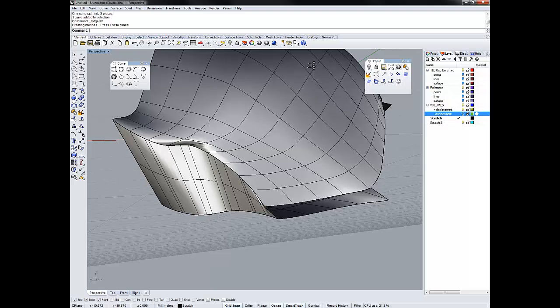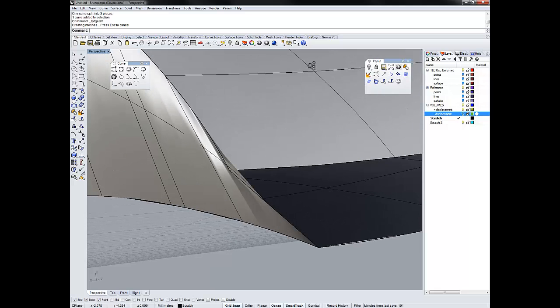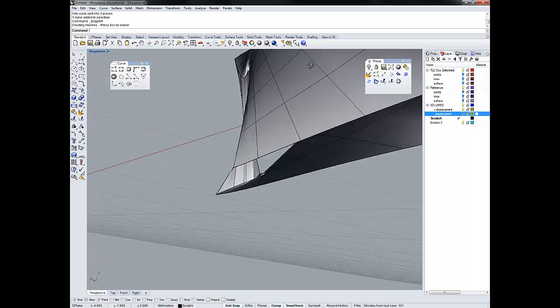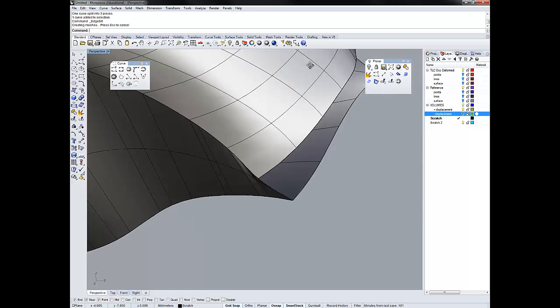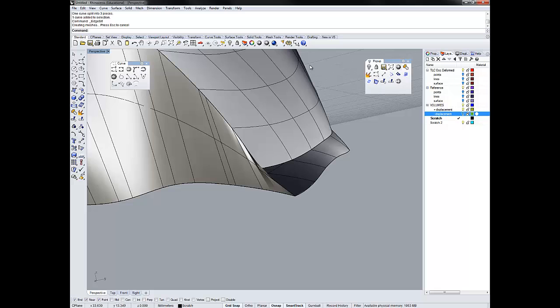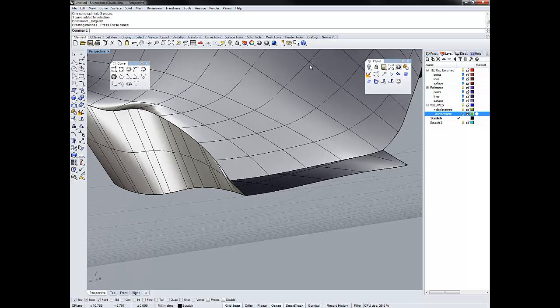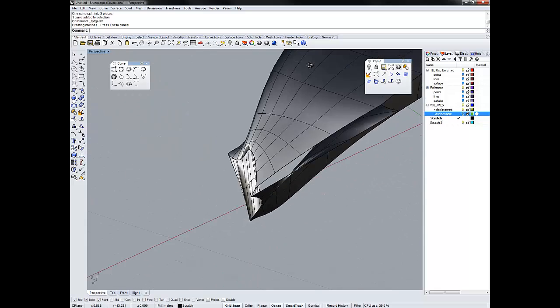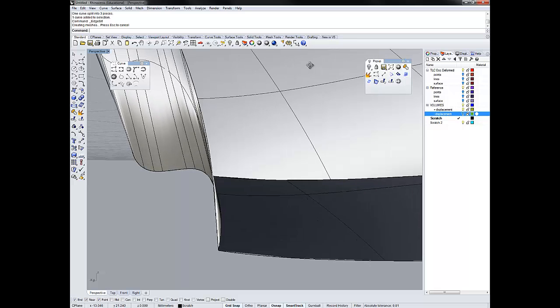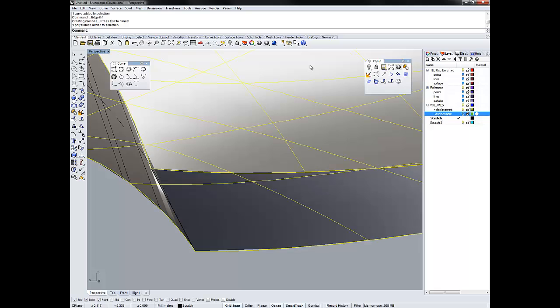And I think we're going to go with it, except right here, it turns in on itself. So this is probably where problems can occur. And so we're going to move forward with selecting it, but we're going to know that we might need to come back and fix this particular part. You might be asking yourself, where does it turn in on itself? And it's a little hard to see, but it's right at this point here.